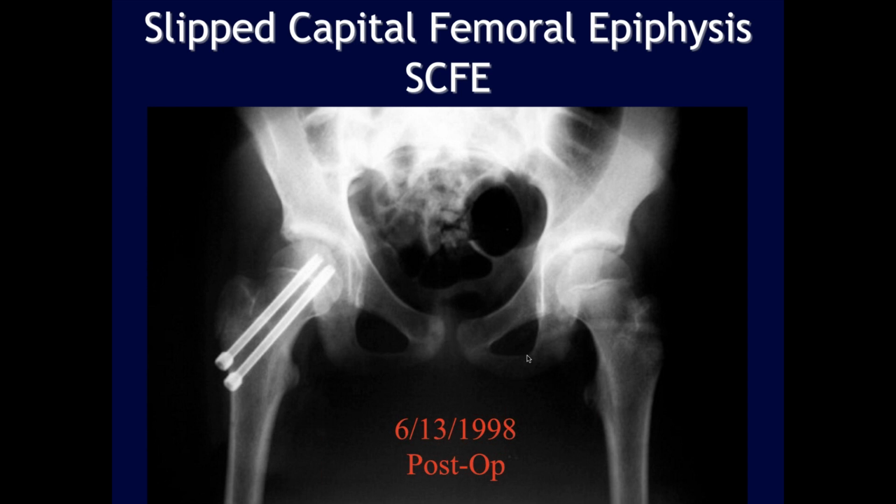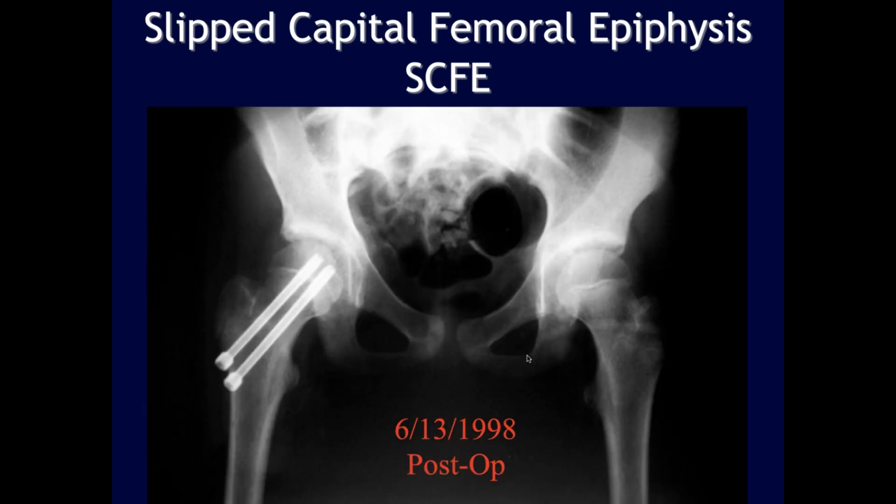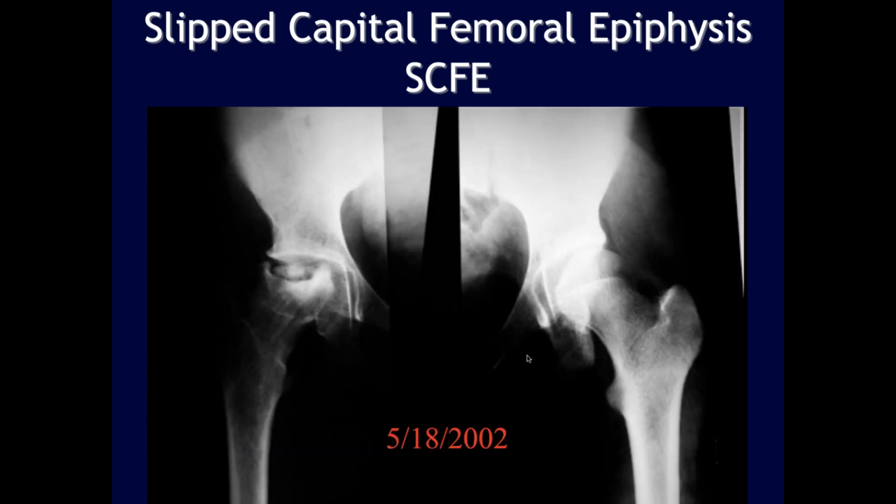So this was the day of surgery. Now all you have to do is pray. Post-op, all you have to do is pray now. John's praying. Okay, this is 1998. Here we are 4 years later. Great. They didn't pray. They didn't pray, John.